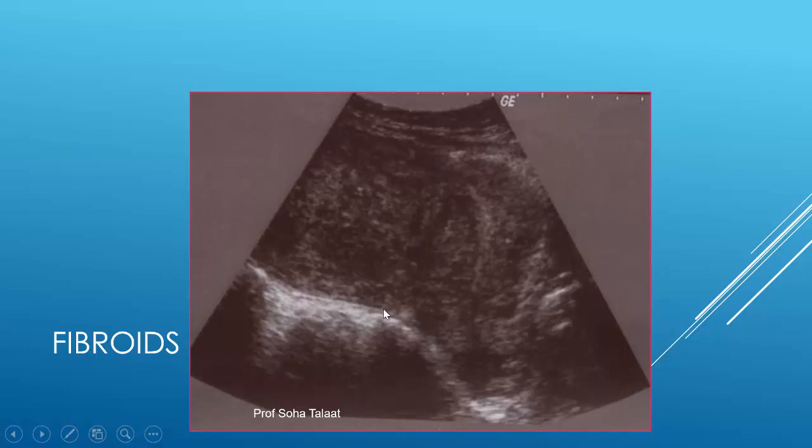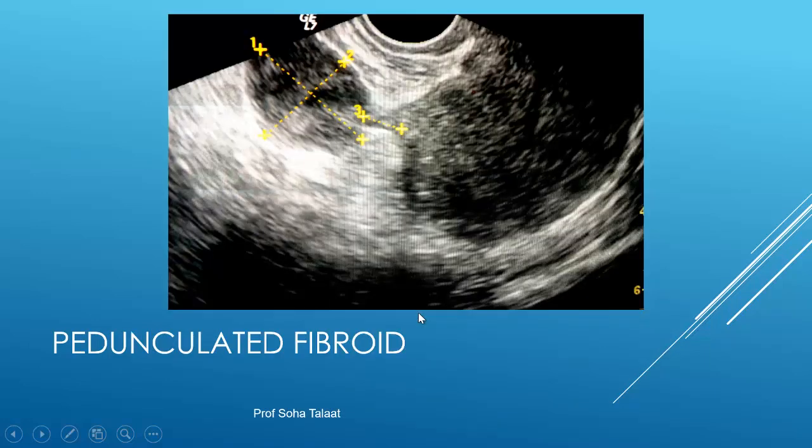When you find a subserous fibroid, you can also measure the attachment with the uterus. Here the fibroid is attached by a large size to the posterior uterine wall, which makes removal difficult, in contrast to the pedunculated subserous fibroid, where we can find just a pedicle.